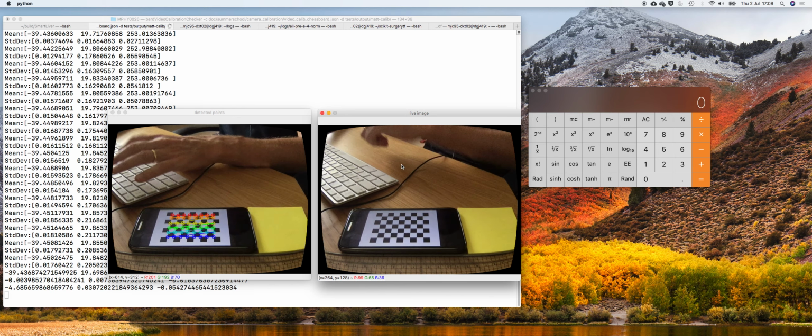Hopefully if I press T, you can see it's moved -4.6, well, nearly 4.7 millimeters in the X direction, next to nothing in the Y, and next to nothing in the Z, which is what we'd expect. So what you could do is repeatedly measure movements of 5 millimeters, collect the data, and calculate the error. In this case, instead of 5, it was -4.7 or so. You want to measure the distance across X, Y, and Z because it might not be perfectly aligned with the camera.